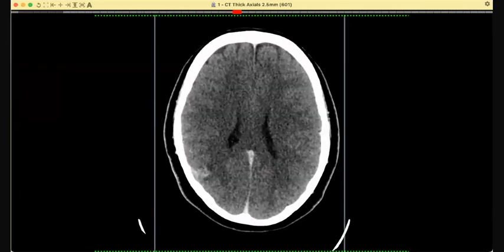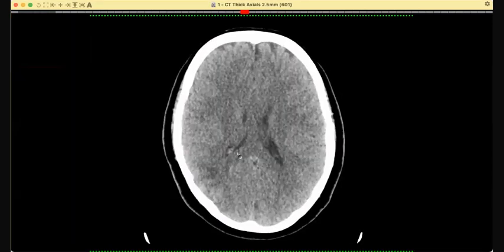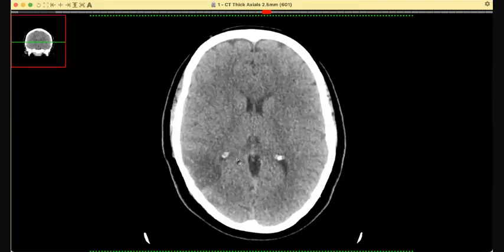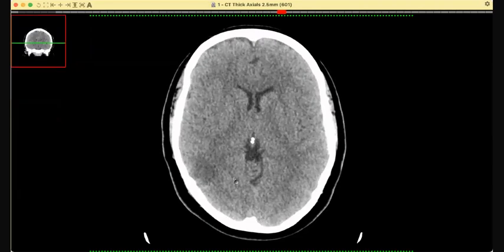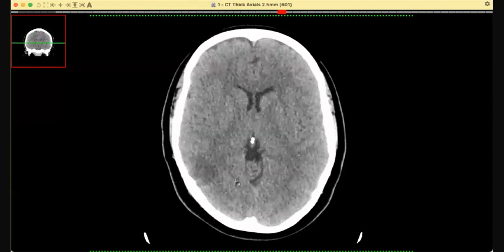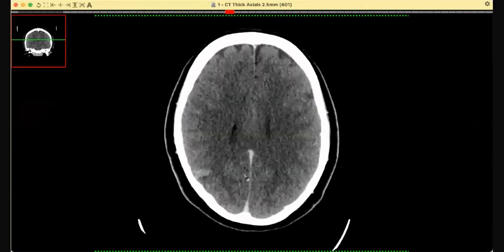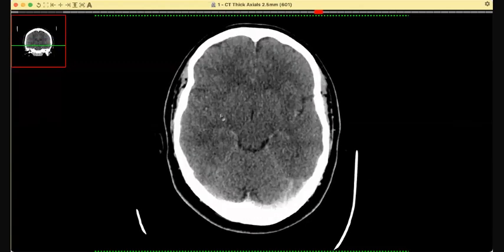now, this case was about 5-6 days old. There can be enhancement. Even in stroke, after maybe 5 days, there can be leptomeningeal gyriform enhancement that will not change anything. This was the initial non-enhanced. And the key finding is that it does not correlate with any arterial territory. And then on post-contrast, there is a bit of gyriform enhancement, which is explainable.